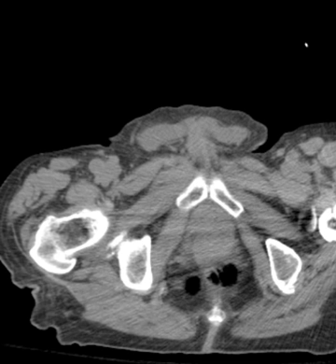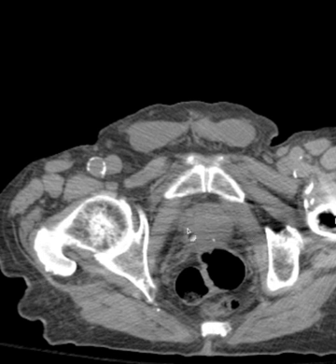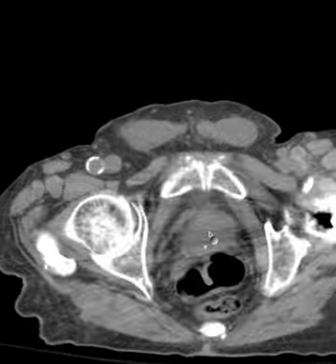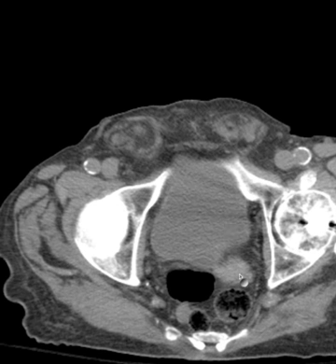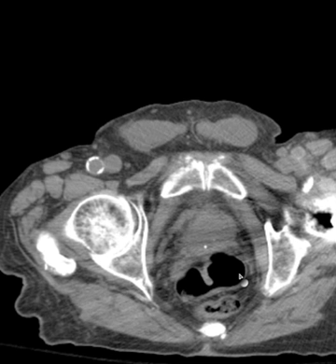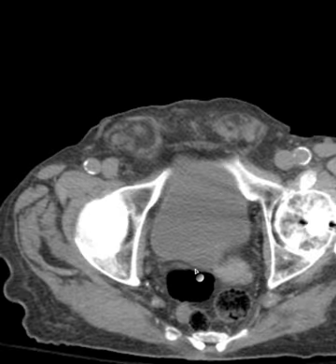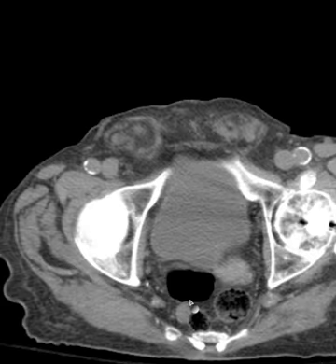Okay, so this is a male, and so that means when we're in this area, this is the prostate. Very important to recognize the prostate. Okay, this is the prostate, and then you get up above that, and you're in the urinary bladder. But look at this. What is this structure over here? Well, there's one over on this side, on the right, but as you go up higher, you see the one on the left is bigger, and it's denser. It actually is denser than most of the soft tissue there, even a little denser than muscle.